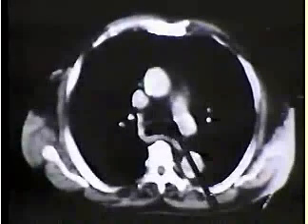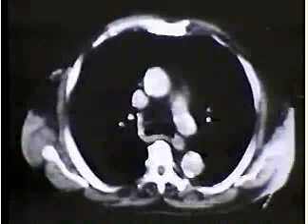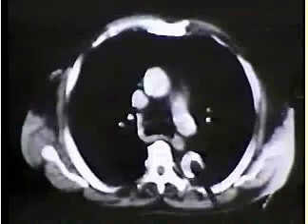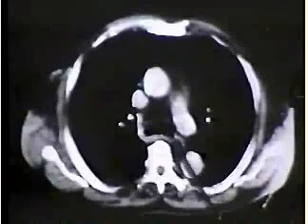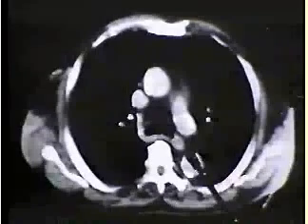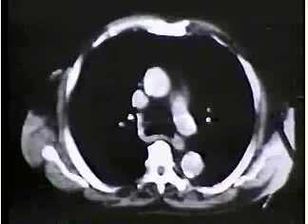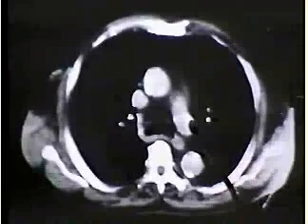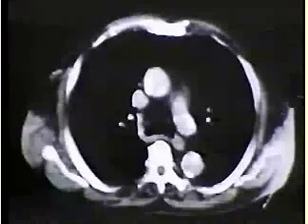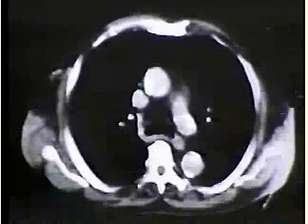Notice that from the configuration of the bronchi, they were already just about at the level of the carina. What's the structure over here? Well, it's not the azygous vein yet. We have another mass there. Oh yes, we've got an esophagus to consider. All right, that's the esophagus. And of course we have the left pulmonary artery coming out of the main pulmonary artery, and you can see the ascending and descending aorta on this scan as well.